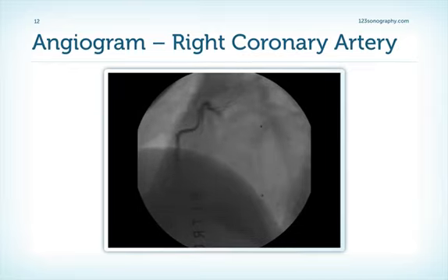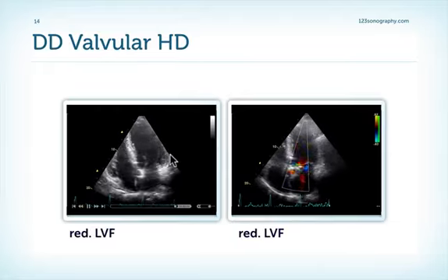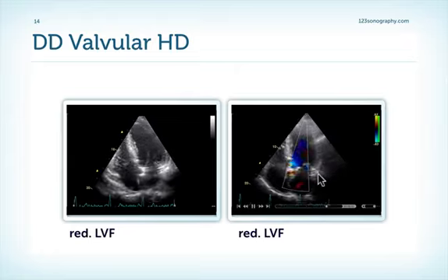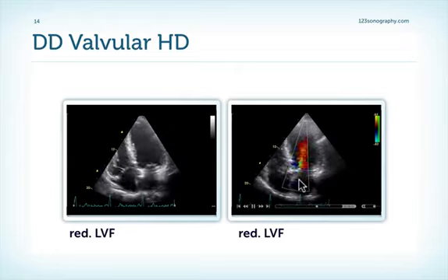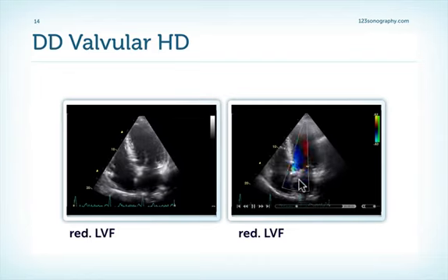So keep in mind, often patients with dilated cardiomyopathy also have some degree of regional differences with respect to their myocardial function. And we know that especially in the end stages of ischemic cardiomyopathy, it is often very difficult to distinguish the two. Here's an example of a patient with reduced LVF who also has LVH. The patient, however, does not have dilated cardiomyopathy. If we look at the aortic valve, we can see that it is calcified. The patient in reality has aortic stenosis, and there's also some degree of aortic regurgitation.